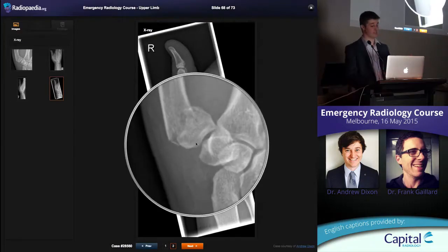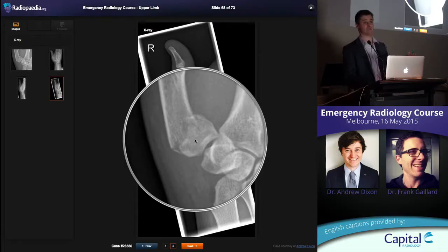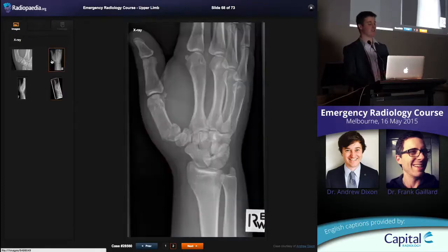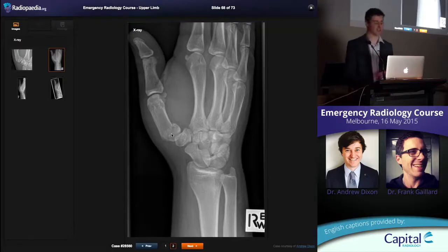It's still a significant fracture. It's called an epibasal thumb fracture or a pseudo-Bennett's fracture. Okay? And the point is that it's displaced, and the thumb is an extremely important tool for human beings, and so a fracture even displaced by this amount needs to be fixed. Okay, so it's just a good one for tricking the registrars who are, as soon as I show it, you see their eyes, they're like, oh, which is it?